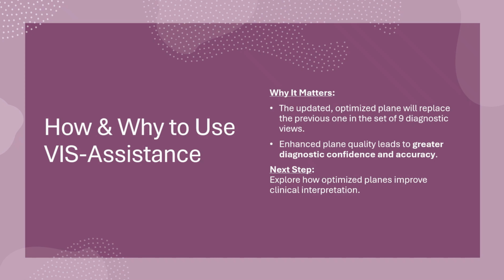Up next, let's look at how these optimized planes can actually enhance clinical interpretation in real-world cases.